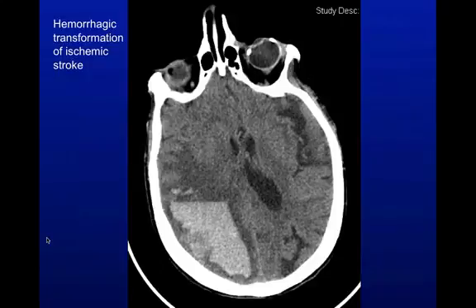Here's a patient with spontaneous hemorrhagic transformation from their stroke, probably about a week out. Okay. So a lot of times we'll warn the folks at a spoke hospital, if you're planning on keeping this patient, just be prepared. They're probably going to deteriorate very suddenly in a few days. There's going to be a big change. You can rescan them, but don't be surprised when you see blood. And let's prepare the family for that as well, to anticipate that there's a good chance this is going to happen.